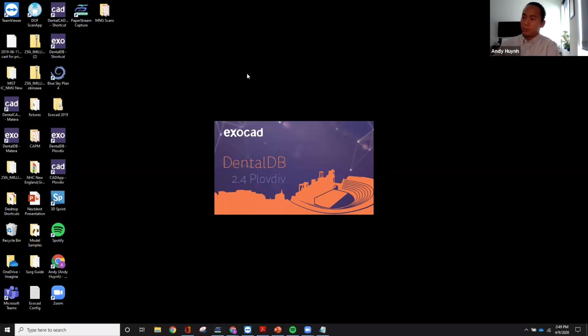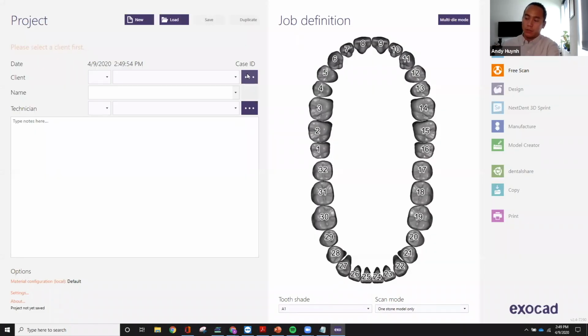And while this is loading, when you're in the freeform, you can use the 1 and 2 hotkeys to switch back and forth between add, remove, and then smooth, flatten. So my mouse never goes from my design to that window. I just switch with 1 and 2, and then Control and Shift to control your size and your strength. So you never have to go back and forth between the windows.